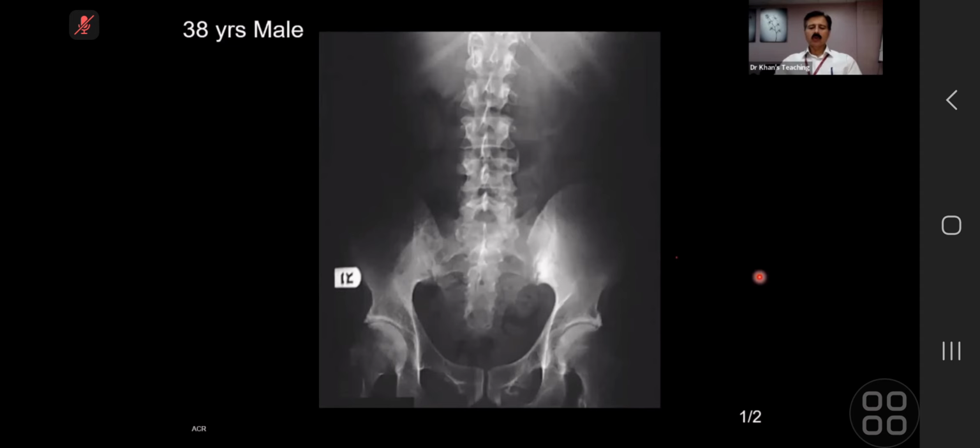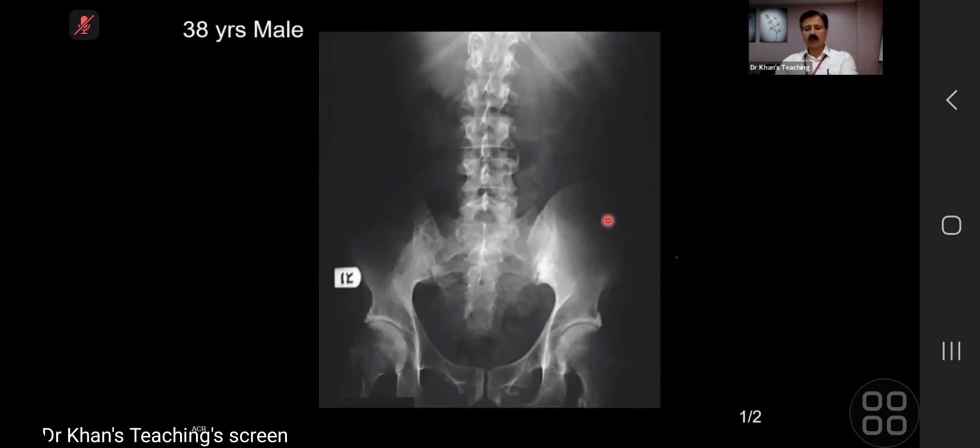No, it shows syndesmophytes, but they involve the whole of the spine. Psoriasis is my first differential. Okay, candidate 4, thank you. I'll mute you, and candidate 5, be mentally ready. You are next. But let me do a bit of teaching on this case.